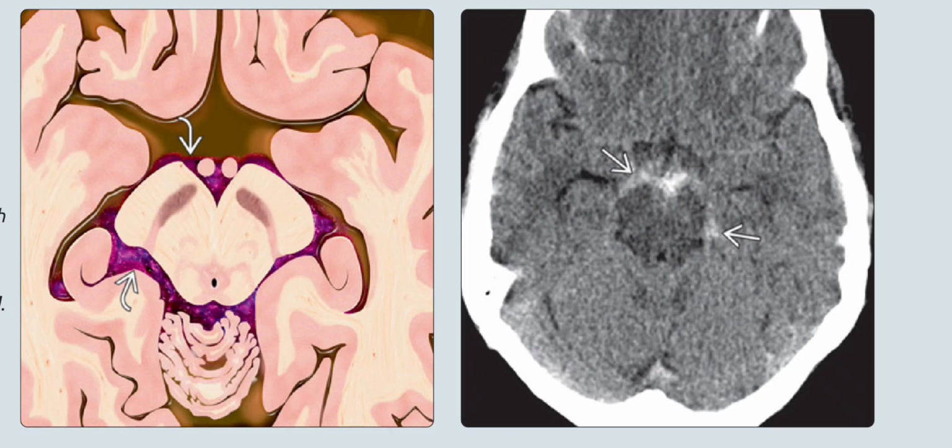Left is the axial graphic, and it shows classic perimesencephalic subarachnoid hemorrhage. Hemorrhage is confined to the interpeduncular fossa and the ambient, that is the perimesencephalic cisterns. The source is usually venous in the perimesencephalic subarachnoid hemorrhages, unlike in aneurysmal subarachnoid hemorrhages.